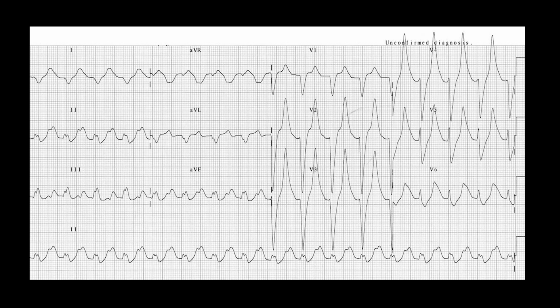And another example there. So again, we have ST elevation and some ST depression, but you can see it produced this wide, bizarre looking ECG with profound discordant T waves that are very sharp in appearance. So could it be an MI? Maybe, but it definitely doesn't have a classic STEMI pattern, and this should give you pause. This is severe hyperkalemia. In this case, you're actually starting to get the sine wave pattern. You can see that really prominently in AVR.